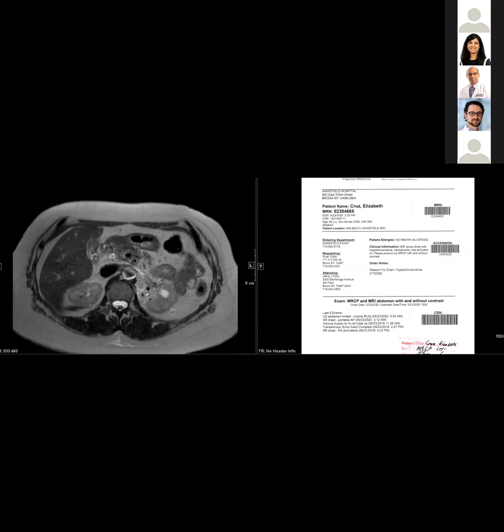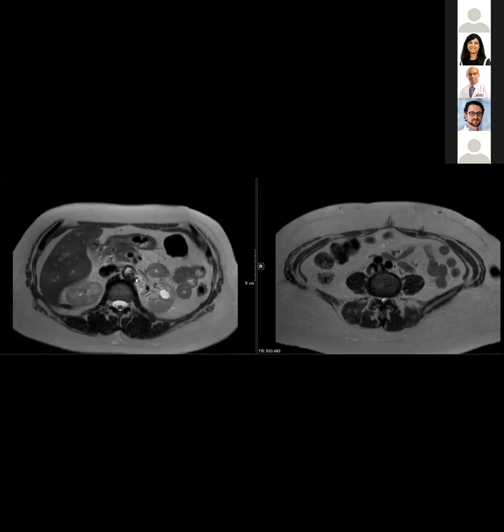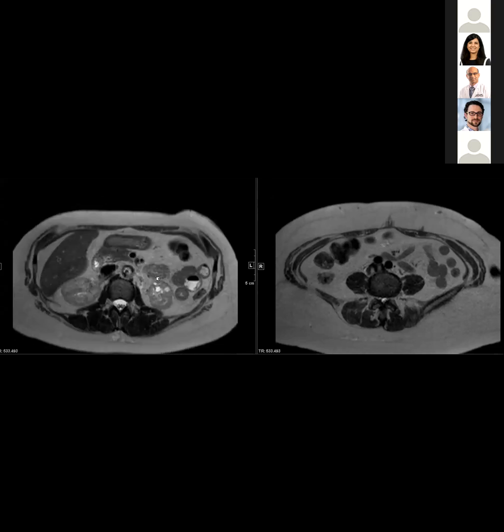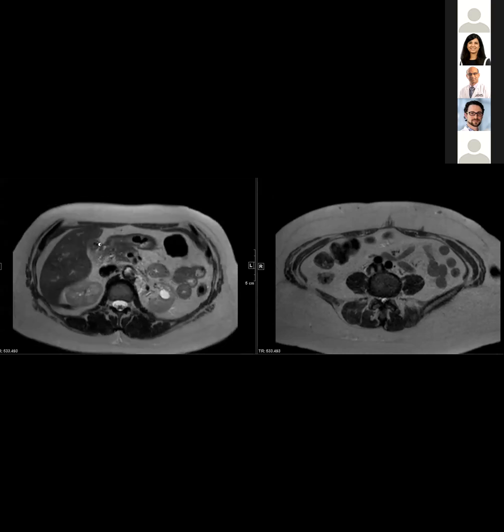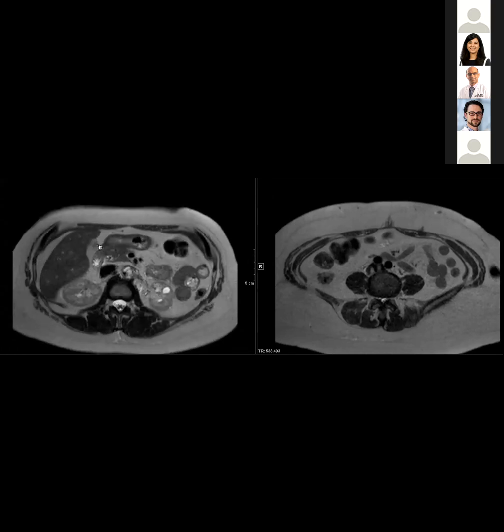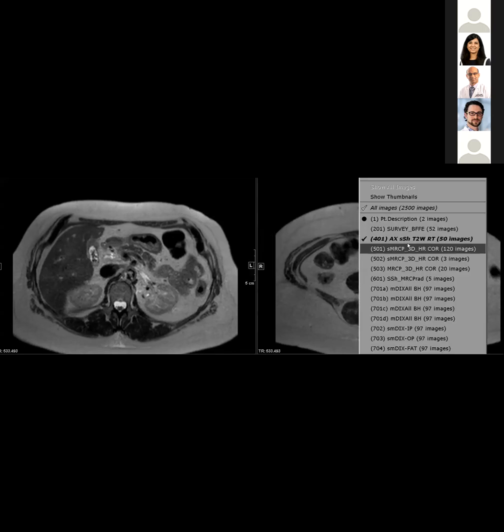It looks a little irregular, Victoria. Did they read fundal adenomyomatosis? Well, I don't think they did. I think they just said chronic cholecystitis. I know what happened to the patient, so it's hard for me to not be biased, but there's a very good chance I would have just passed it as adenomyomatosis, even though I'd like to see T2 hyperintense foci to be definitive.